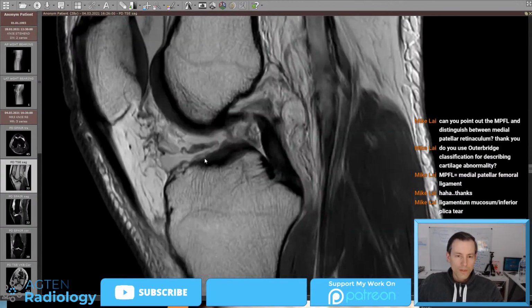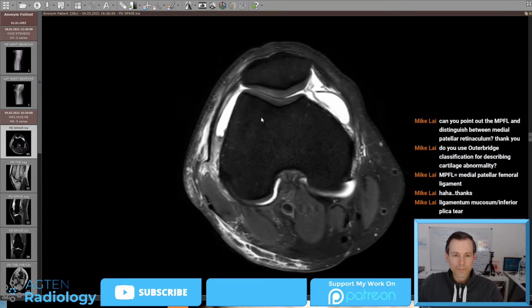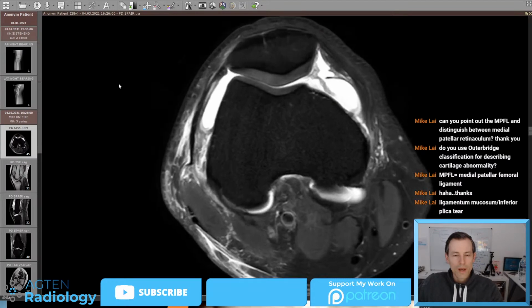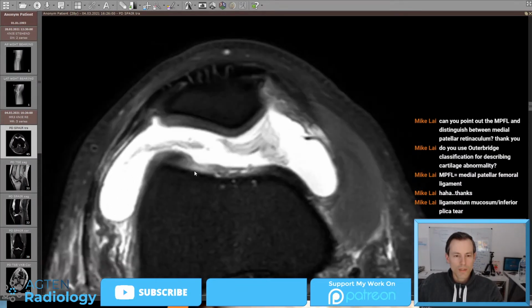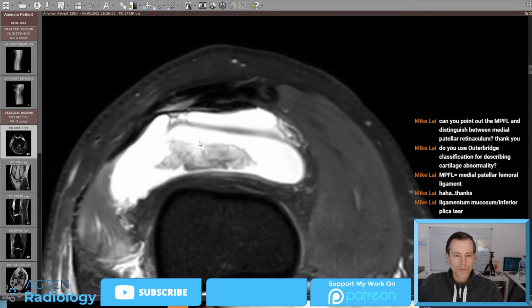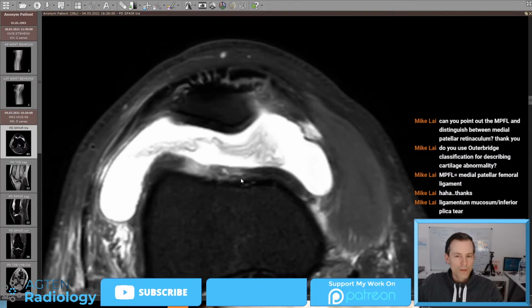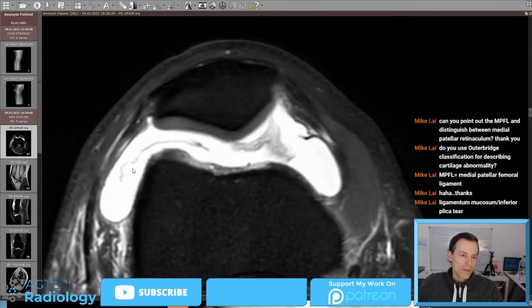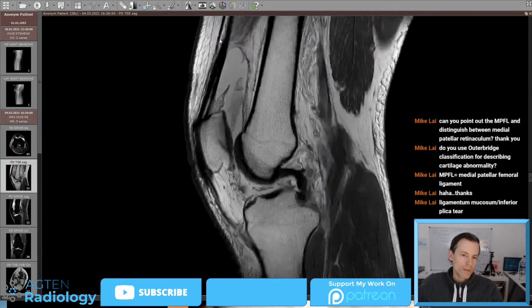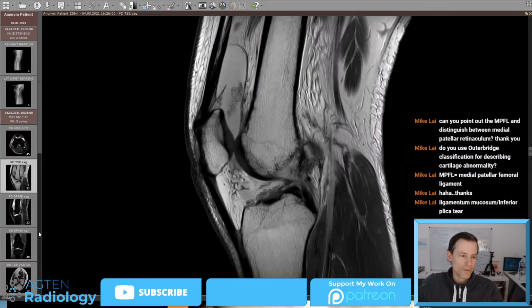So I think that's all for the central compartment here. Now moving on to the last compartment, which is the femoral patellar compartment. And we can see the cartilage here, quite nice. We can see a lot of effusion, and this is now certainly some blood clots after hemorrhage initially, now forming here in the superior recess. Now the quadriceps tendon here is good. Patellar tendon looks also unremarkable.